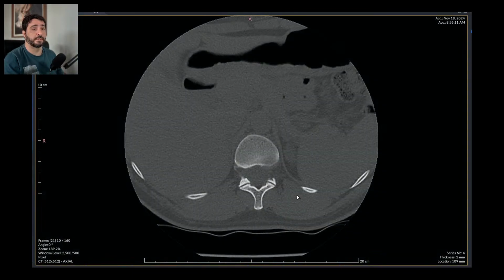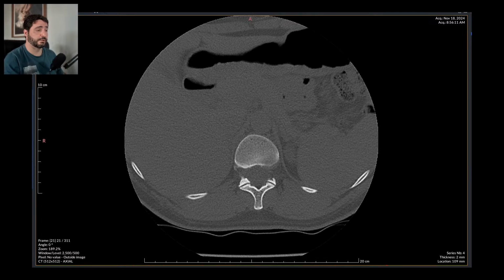This is a female patient. She is 42 years of age. We are downloading it quite fast. Maybe 20 seconds, less than 10 seconds. And we are going to be able to see whatever it is that we are supposed to see.